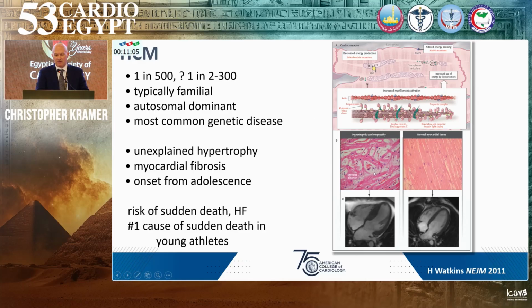As Dr. Moharram mentioned, the pathology is one of myofibrillar disarray and interstitial fibrosis, compared to a normal on the right. And here's a typical 4-chamber long axis view in a patient with reverse septal curvature morphology compared to a normal on the right.